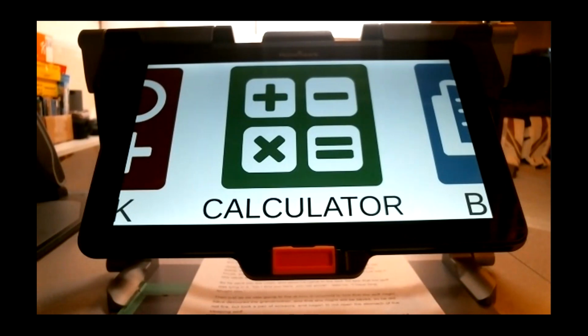all the applications. The tap and the press and hold are very widely used gestures in Prodigy, and your fail-safe or principal gestures would be the double tap, the two finger double tap, and the 4 or 5 finger press and hold on the screen. That will bring you to the Android system or back to the main magnifier. And again, you can use all these gestures on the Reveal 16i, which runs the same Prodigy software.